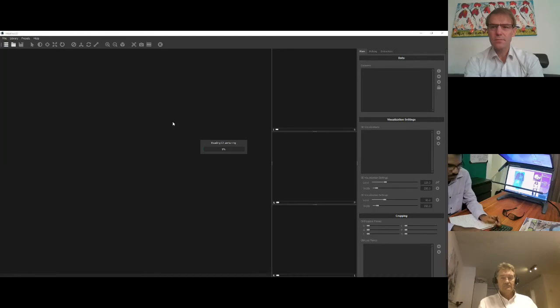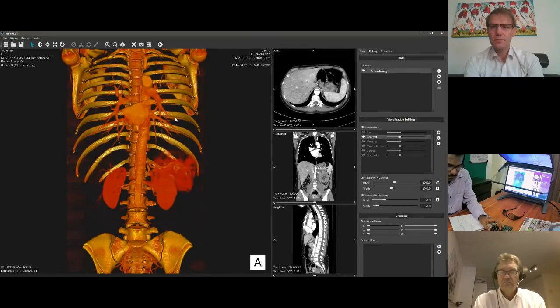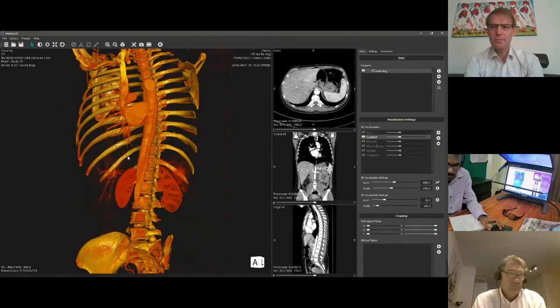So Arjen already showed that there was a possibility of using ultrasound data, and the ultrasound data is actually often 4D. We're now also in different projects where we're extracting, for instance, scar tissue in the heart, where we're using specific settings, and we work there with manufacturers of the scans. And so here we have a very beautiful data set.